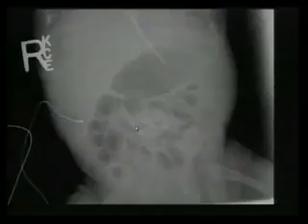If you do a lateral view of the chest or a lateral view of the abdomen, standing up, you'll see the bowel gas in that big old hernia. Sometimes people will think that's another type of mass or something. That is an umbilical hernia, usually in African American babies. This liver is generous, but we're talking about gas right now. Do you see any abnormal gas?